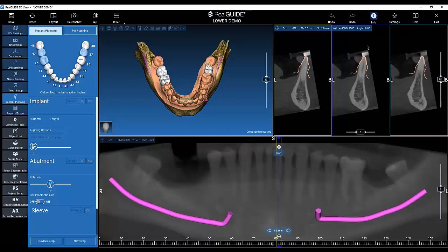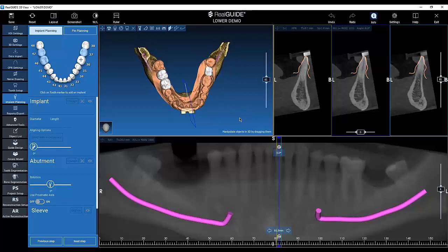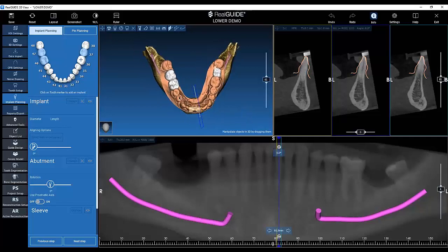You can see that the center cross section is circled in blue, meaning that this is the cross section cut by this blue plane here, while the yellow and the light green cross sections are the other little lines you can see here, yellow and light green. In the 3D, you can make the blue line appear by clicking on this icon. Okay. This is very useful for navigation in the 3D.